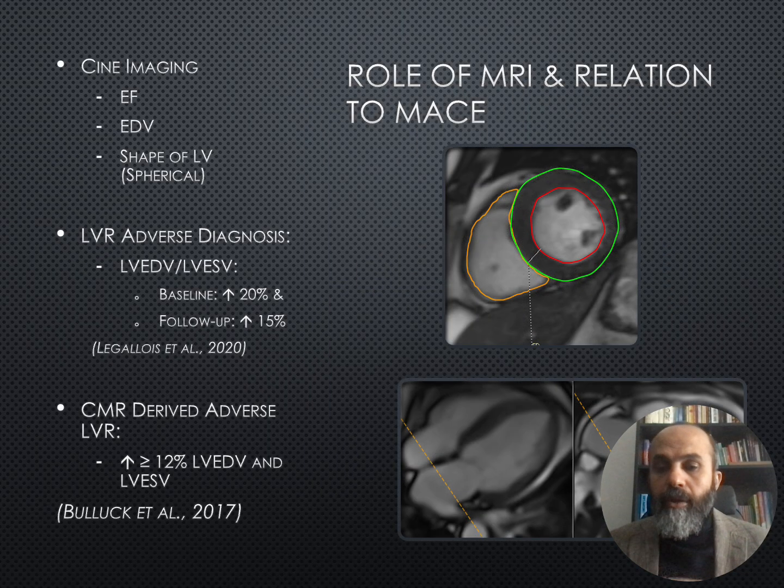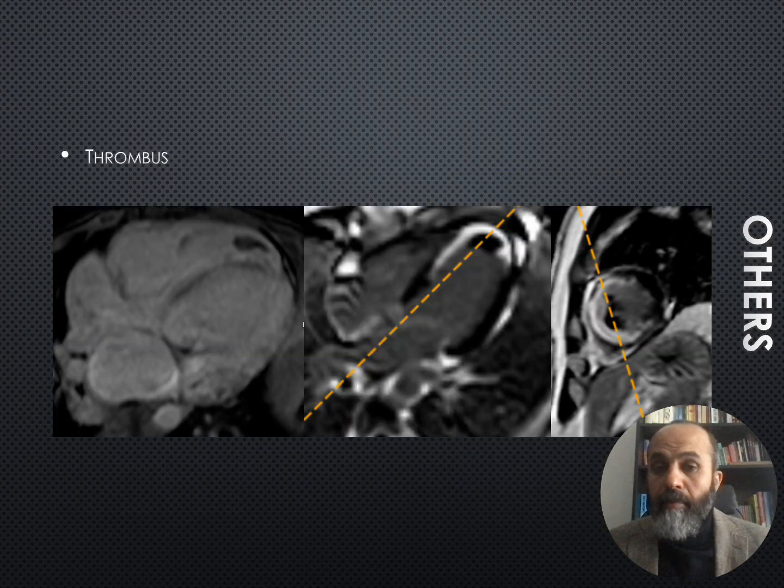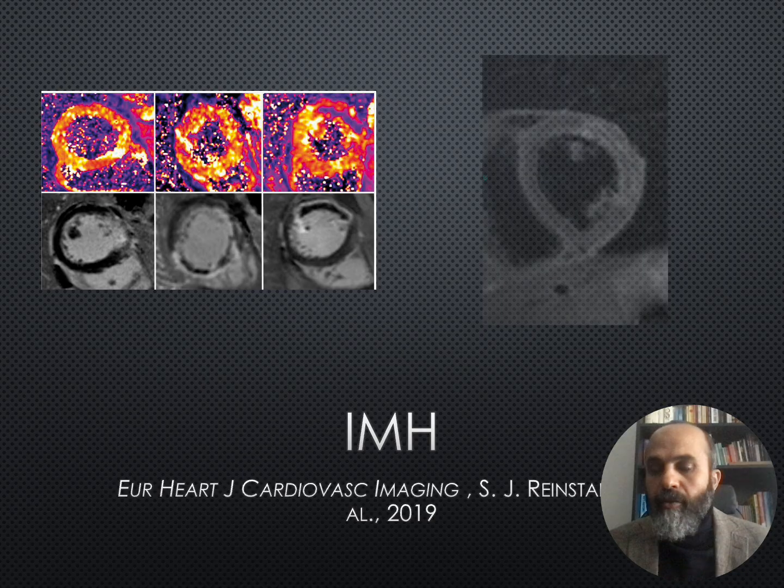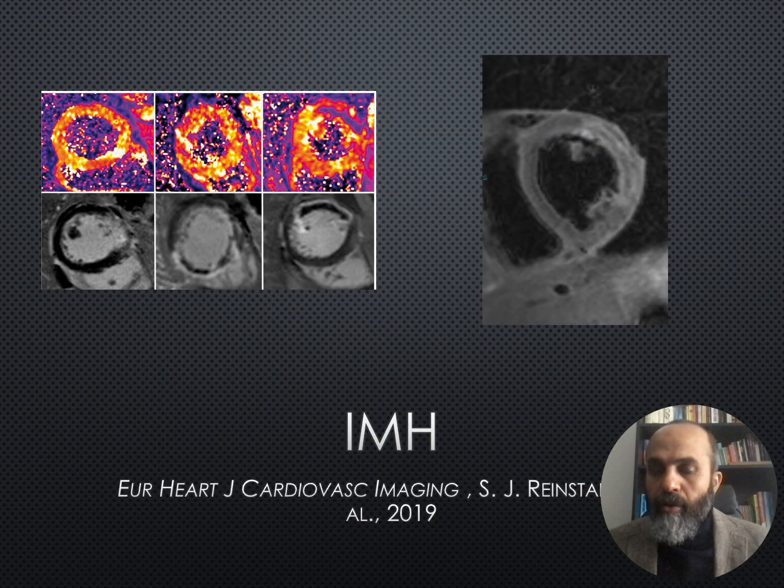Always, if you reach the diagnosis, go beyond, because it requires prognostic factors for those patients, risk stratification. Would that patient be expected to be admitted to the hospital in the next 5 years? That is for the MACE risk stratification. So go beyond in the functions and the volumes, the MVOs, and the amount of the MVOs, and also if there are other things, for example, thrombi in the left ventricle, and also the forgotten ventricle in ischemia, so a thrombus in the right ventricle, or if there is a pseudoaneurysm or a true aneurysm. Of course, those factors would tell you what is the prognosis of the patients.